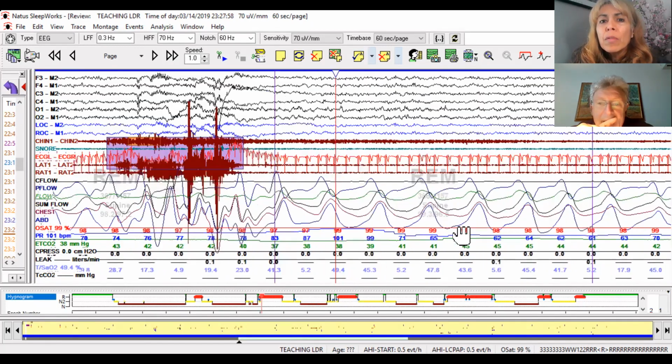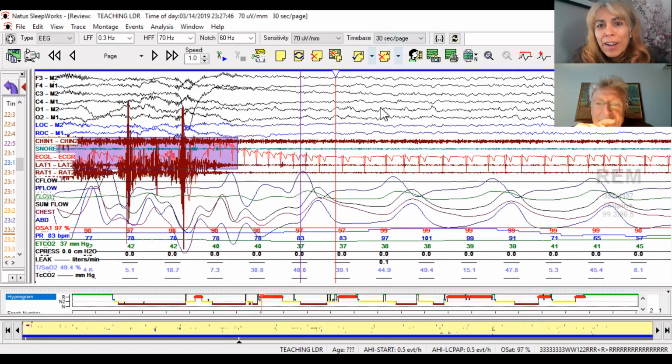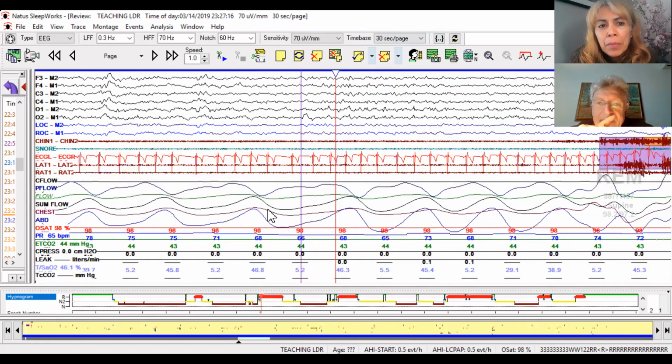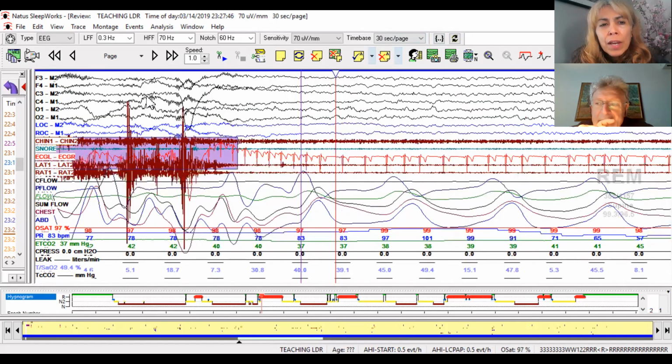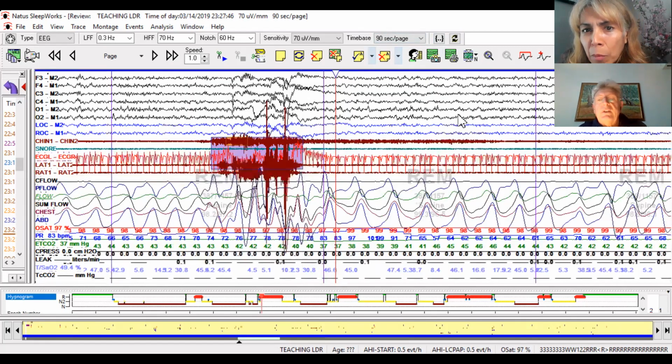Okay. I have to refresh my REM scoring rules. And this may not be the right time to confuse everybody with this, but do you think it's possible that when you have this movement, it bumped the stage from REM to N1 because there are no rapid eye movements?